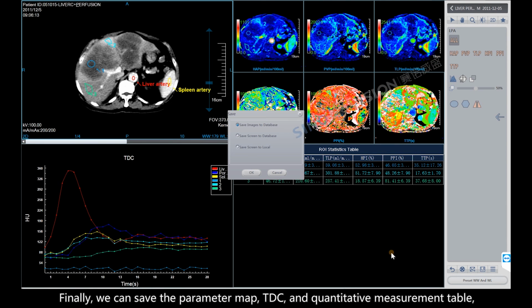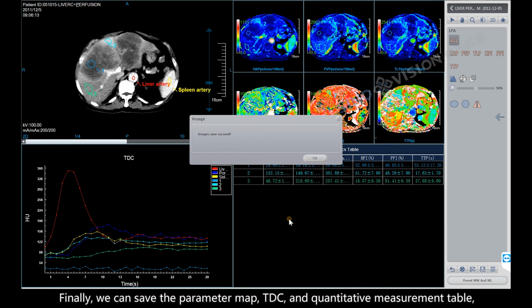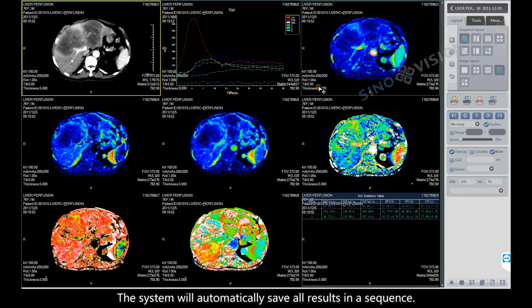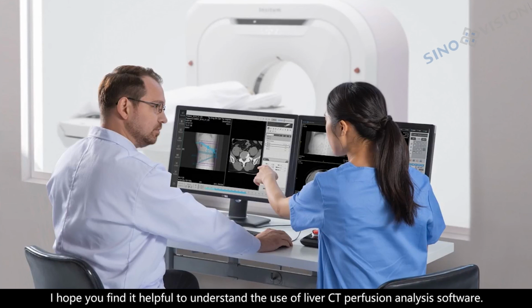Finally, we can save the parameter map, TDC, and quantitative measurement table. The system will automatically save all results in a sequence. The introduction is stopped here. I hope you find it helpful to understand the use of liver CT perfusion analysis software.